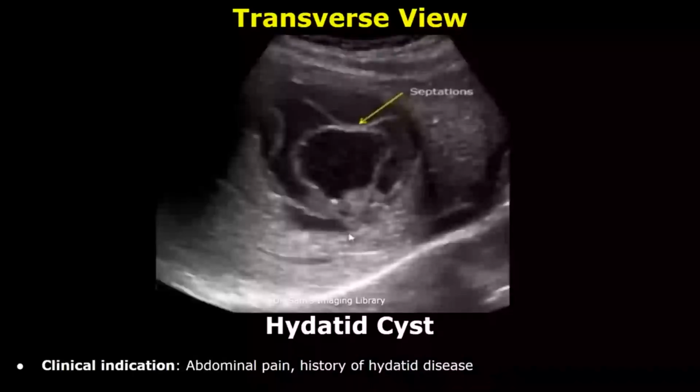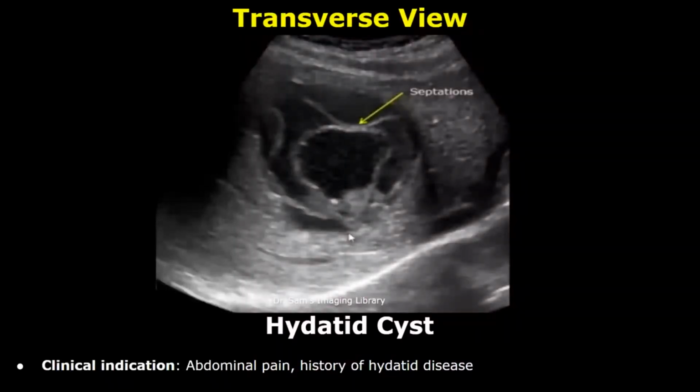This is a case of hydatid cyst. The clinical indication in this case is abdominal pain and history of hydatid disease.